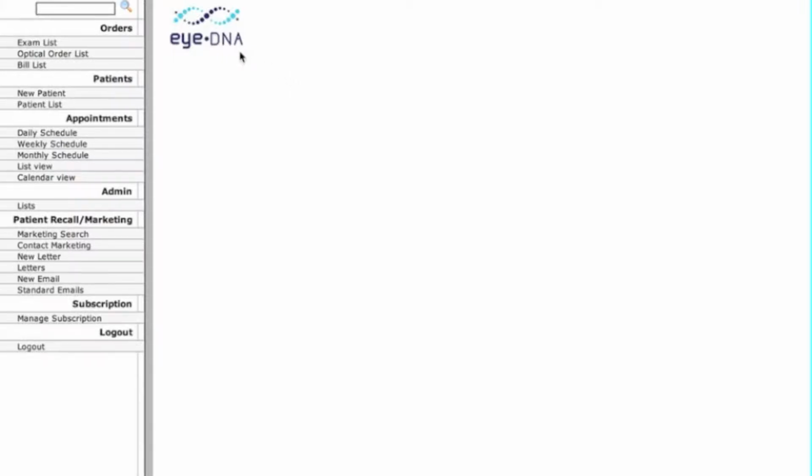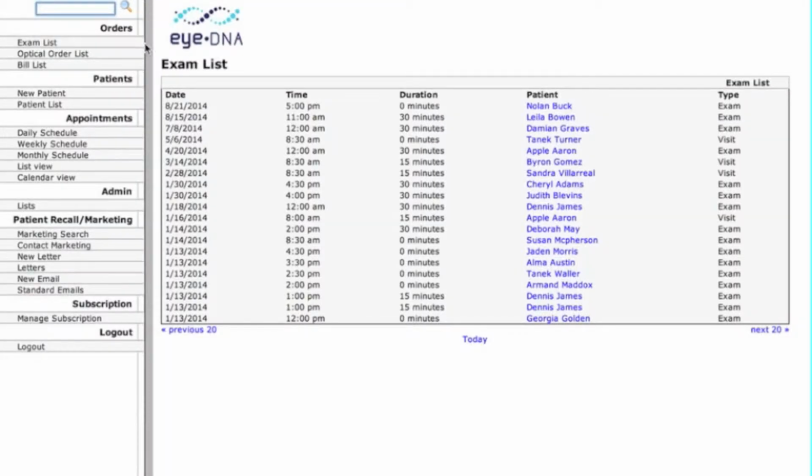The recent prior and upcoming activity snapshot of the patients in the cycle is shown by lists. The individual patient record, order, or bill can be chosen to access patients in the stream by clicking on their name. This is convenient, so most of the time you can reach the correct patient record without having to type their name out in a search. Typically, a patient that is presently in your office will be near the top of the list. To access a patient not in the current snapshot, simply search from the upper left box.